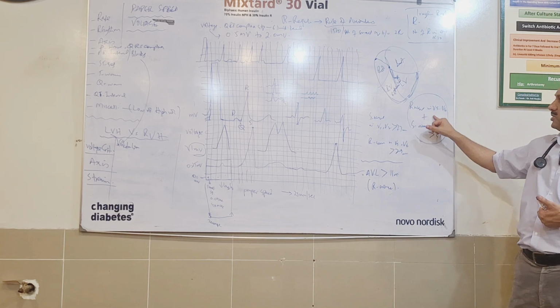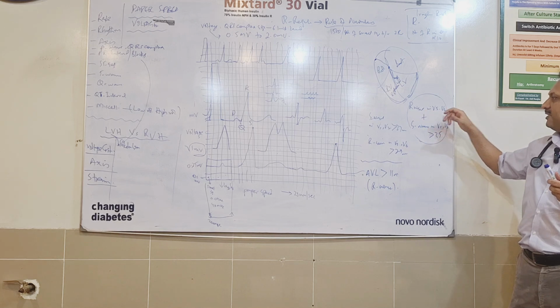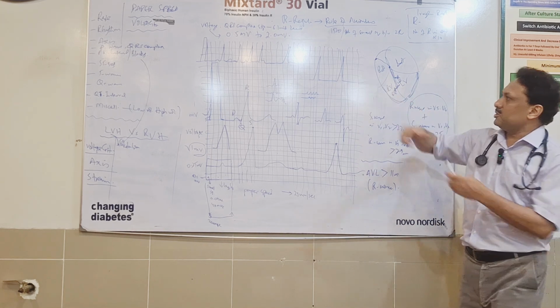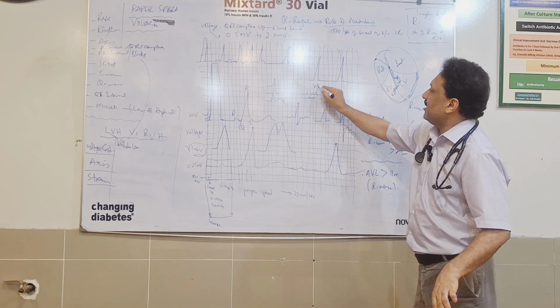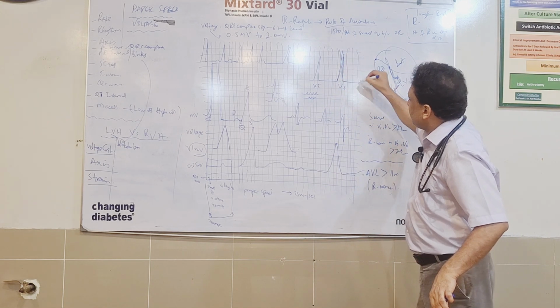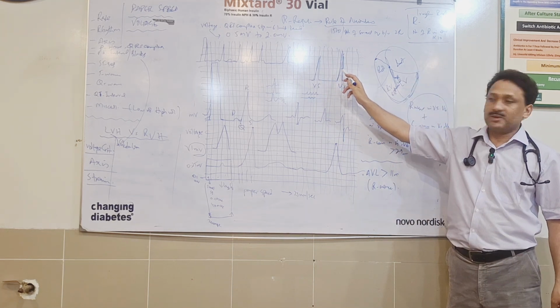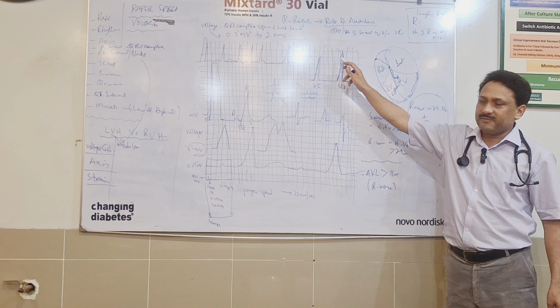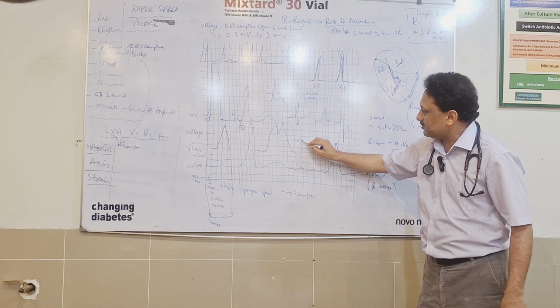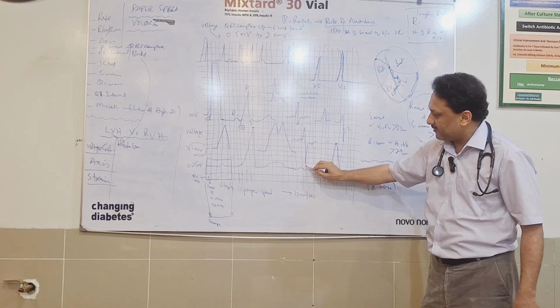27 mm. But the most important one, you sum up the R wave in V5, V6 and the largest R wave. Like you see these two, say V5 and V6. Now one of the leads is having this R wave, the other one is having this R wave. Which will I take? The one which is larger. I will calculate this R wave, and if somebody is having the S wave, say this is the S wave, this is the QRS complex, and this is S wave, right?